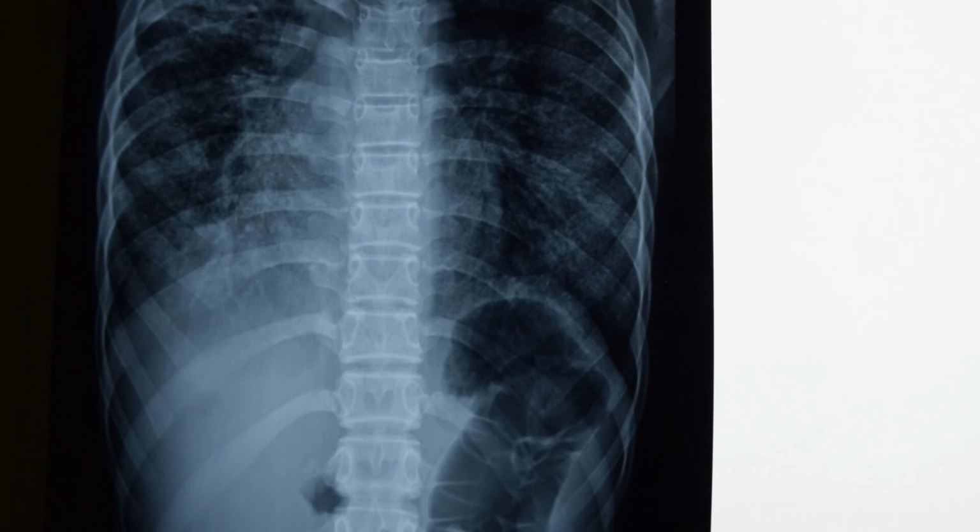If a patient is having history of stone cutting or working on marble stones or different marble factories, he can also have similar bilateral infiltrates, and there can also be some calcifications which are incidental findings on the chest X-ray. So summarizing up, this is an X-ray of miliary tuberculosis as patient had history of fever, productive cough, and shortness of breath.